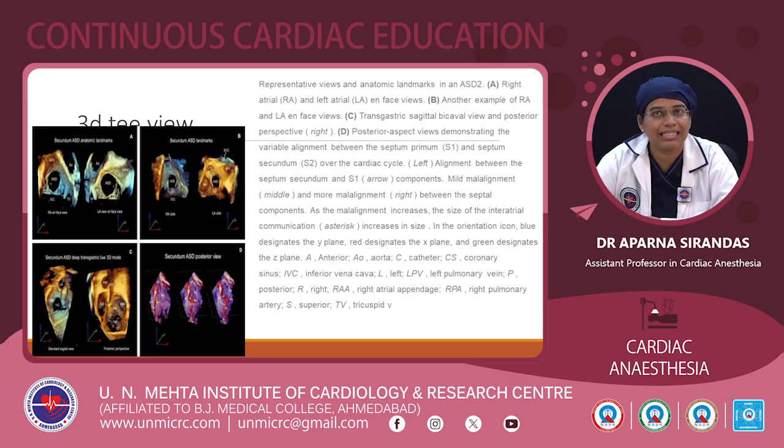that is, in this figure you can see S1, and the septum secundum S2 over the cardiac cycle. The left one shows alignment between the septum secundum and S1 components, then mild malalignment and more malalignment between the septal components. As this malalignment increases, the size of the interatrial communication increases. In this you can see the asterisks where the malalignment is gradually increased.